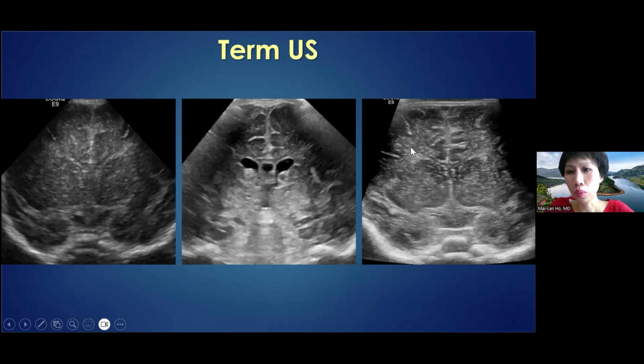And then here's another one where you actually have almost like a super scan. So you have diffuse white matter injury here. And then it's actually exaggerated contrast with the more edematous gray matter. So you can have either decreased or increased contrast, but both are abnormal, right? And obviously you have to correct for ultrasound artifacts and gain and things. But again, I think the clinical picture and then being able to really look at that gray-white distinction and so forth is helpful.